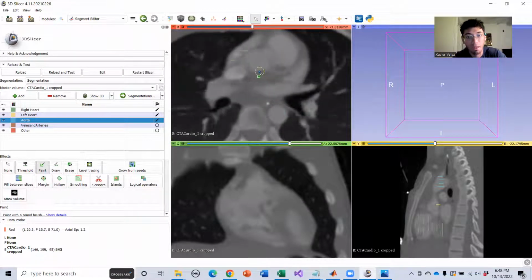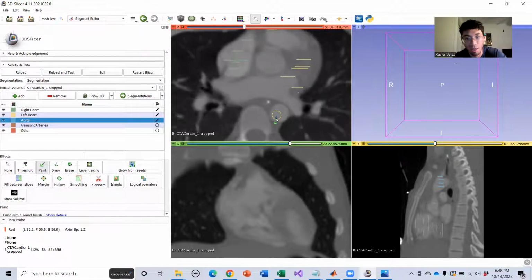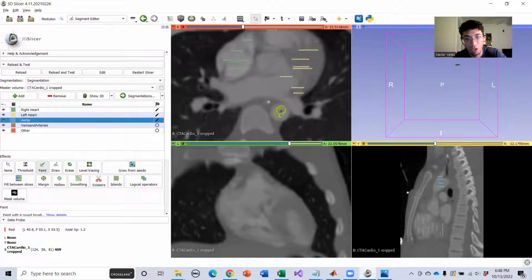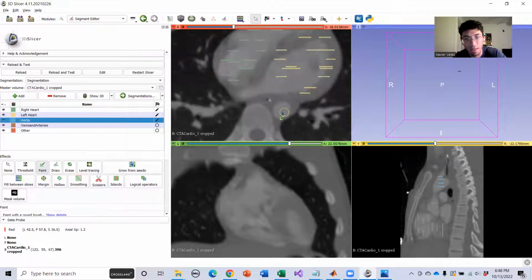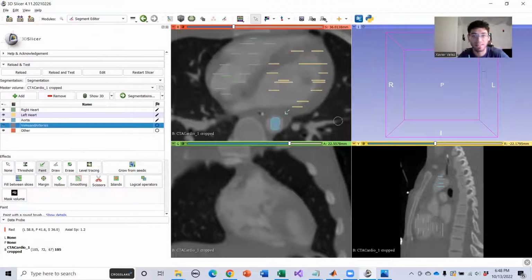Okay, and I'm going to leave that as that for the inside. I'm going to keep going just a little bit further down on the outside, just to get some of that neat old heart action, right? Okay, cool. That's aorta. I'm going to say boom, that's done, right?